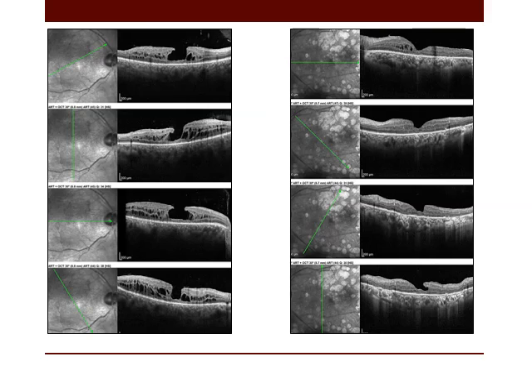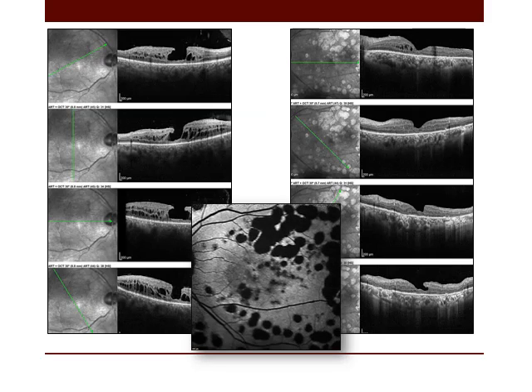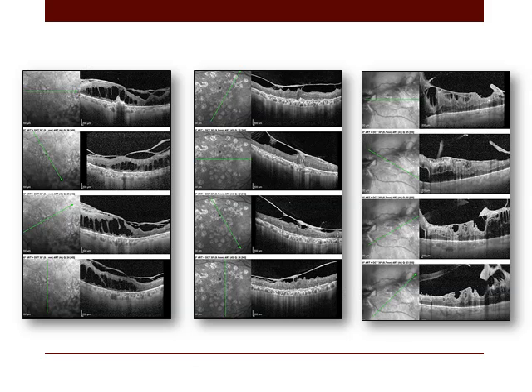Epiretinal membrane inducing tangential traction with rupture of the central cyst resulting in both pseudo and lamellar macular holes. Again, epiretinal membrane inducing lamellar macular holes, mostly due to extensive previous laser therapy.